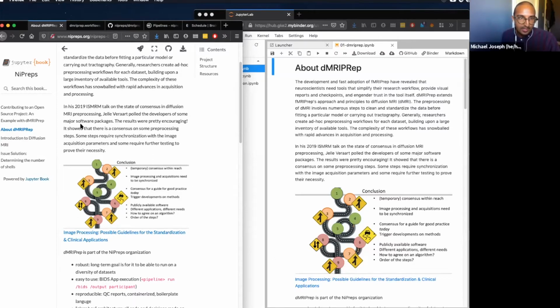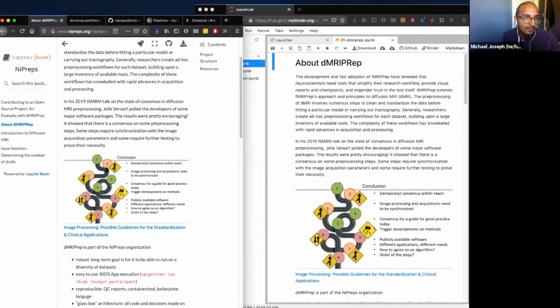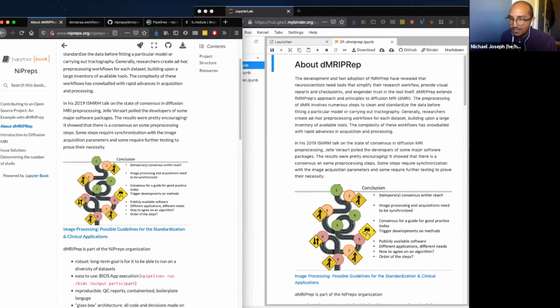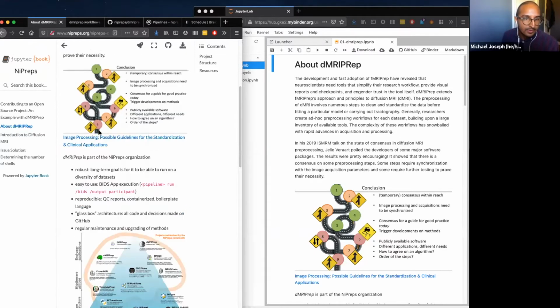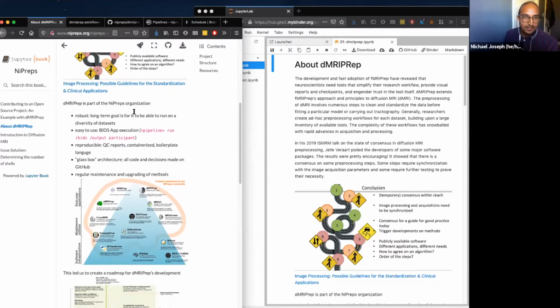I'll talk about how, maybe I'll actually share my whole screen. I think that'll make it easier. All right, there we go. Next I'll talk about how dMRIprep enables us to answer all these questions. dMRIprep is part of the NiPreps organization.